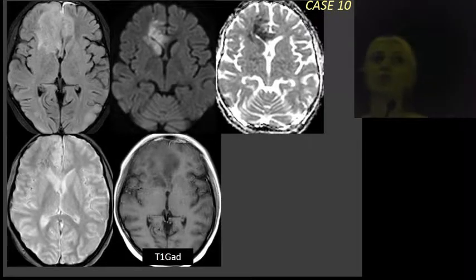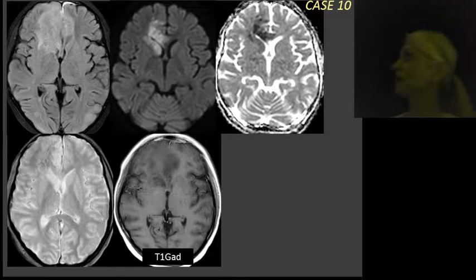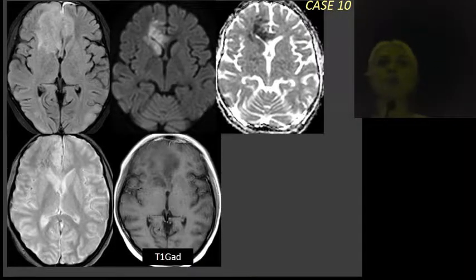This is a patient who was, I think, 2 months after organ transplant, he came in and he was having this lesion here, in the frontobasal region. It's restricted, it has a low ADC, it has some kind of dots, obviously a little bit of petechial hemorrhage, and then it was not enhancing. So now, what is the most common thing that this patient will have, especially in the frontobasal region, especially if they have also problems with their paranasal sinuses and they're immune suppressed?